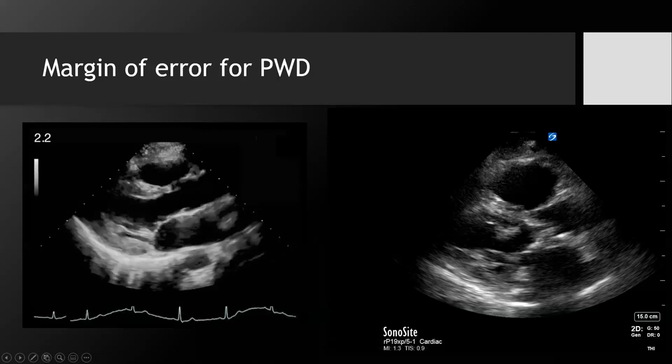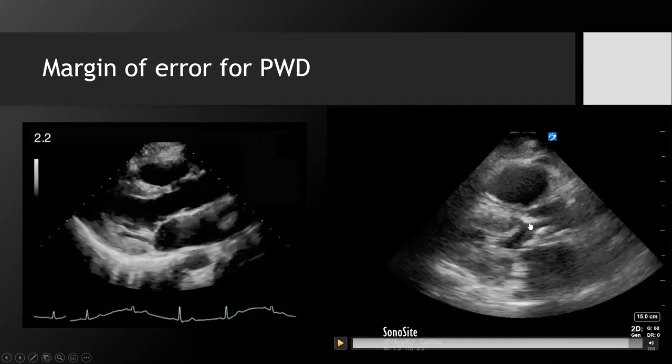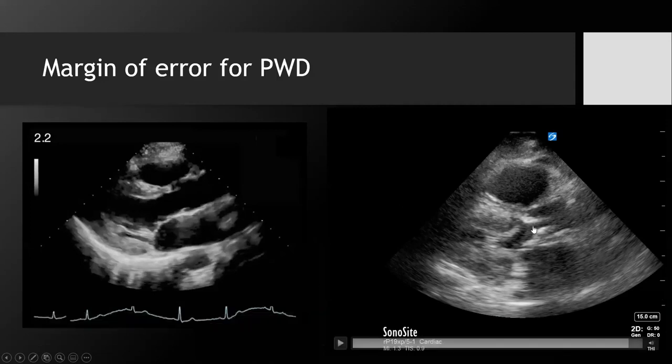I think that's helpful, because when you have a patient like this one, one of Saris's echoes, where your LVOT diameter is here and your aortic valve is so stenosed, you have much less room for error. That's something I keep in mind when I'm doing VTIs. If I'm not sure about my angle, distance, or depth, and I can't really see the apical 5-chamber view, and I know I have more wiggle room, I might be more likely to rely on it than in a patient with AS, where if you're off by a millimeter, you're completely off, and I would hesitate much more. So that's just how I think about it sometimes.